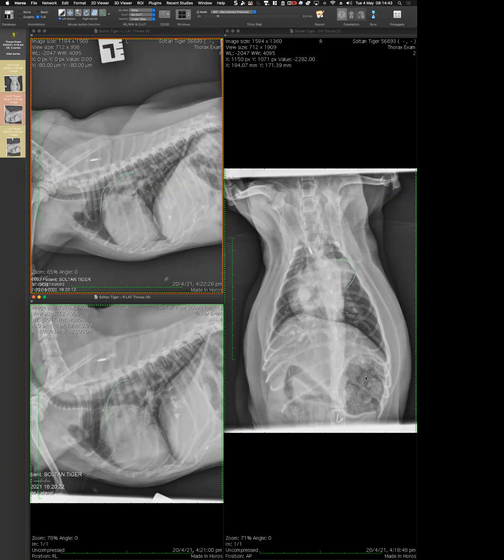Okay. So the addition is that at least part of what we are looking at is in the area where we expect to see the pulmonary artery. Yes. And then, Helen, you are saying that also justifies the heart being tall. Is that correct? Yes. Okay, good. And then we explore all of this.